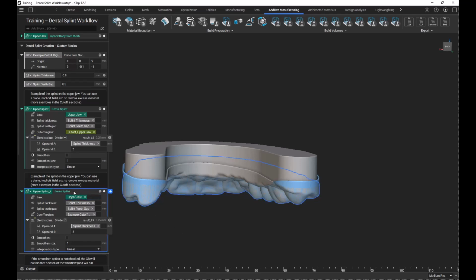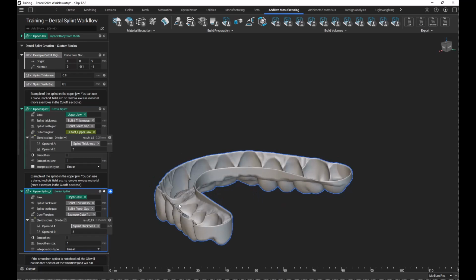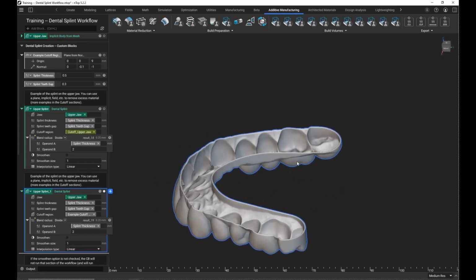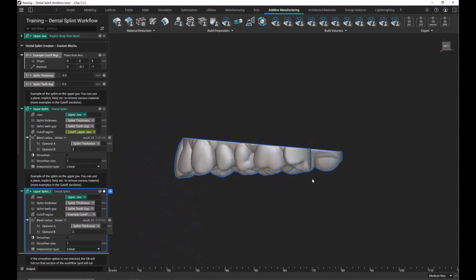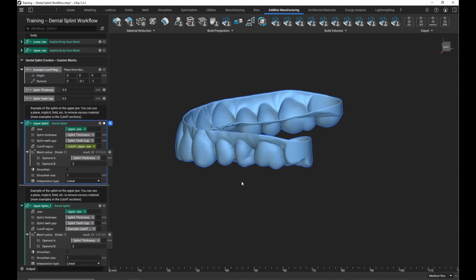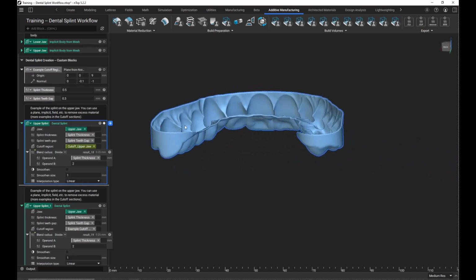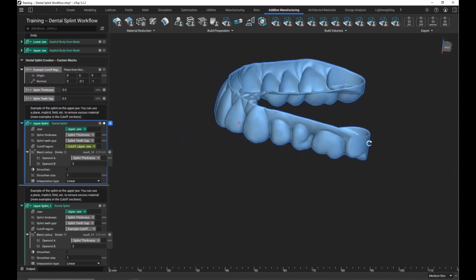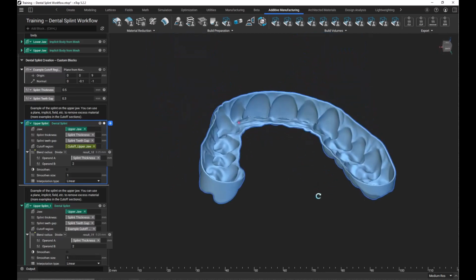Is that with my initial one, with just the example teeth, we're just using a plane. So you can see I have that excess geometry we probably don't want there. That would be kind of hitting into the gum. Some of these regions we maybe don't want to have included. So with the cutoff region that I'm using a field for, I am able to have something that is lower inside and then larger outside. So it's a bit better at following the geometry that I want.